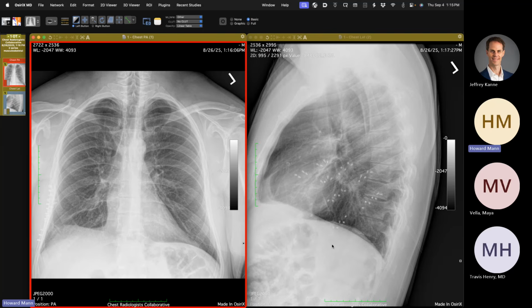These screws must transfix fracture fragments, and just dozens of screws in multiple ribs, but without plates. So that's pretty unusual. First time I've seen that particularly. So certainly a curiosity. I don't think we see that anymore. Have you ever seen screws without plates? It's odd. No. Yeah, don't know what to make of that.